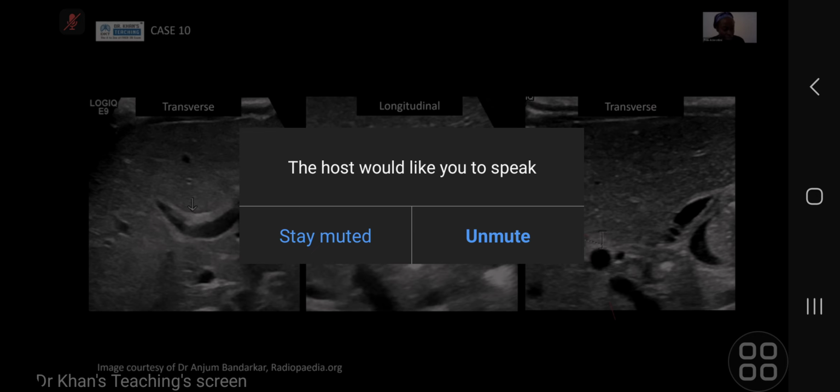And if you see any irregularity of the gallbladder as well, then that suggests that your gallbladder is abnormal, which ties in with the diagnosis of biliary atresia. And then this picture just shows you the triangular cord sign on a transverse image, but I normally measure it on another transverse image, which is where I normally measure it.